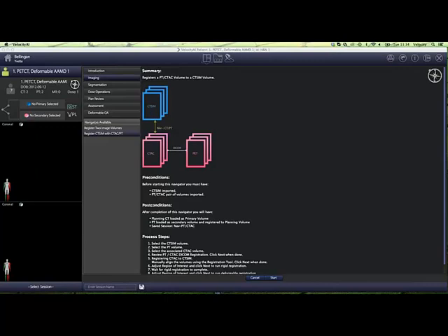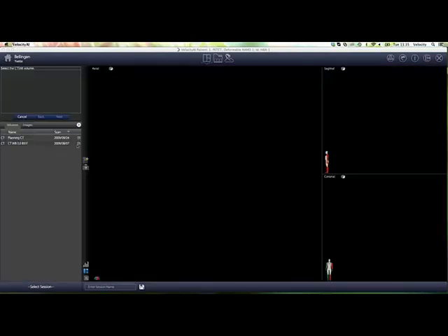Sometimes the patient moves between the CT part and the PET part, and in our software, we can correct for this. So once I've reviewed this and I'm happy, I just want to show that this is the area of concern for us. In the department, you're going to have the pathology notes and all the patient notes. Use them when you're doing a deformable registration, because that is the way you will check what is important. So I'm just going to change the contrast to my secondary.